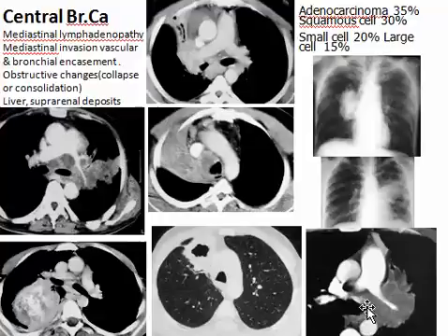And here the mass is around the left main pulmonary artery. This is an example of unilateral hyperdensity and prominence of the hilum, and here on the other side is a hyperdense or prominent hilum. But mind you that the changes in oat cell and small cell carcinoma are not so apparent like this.